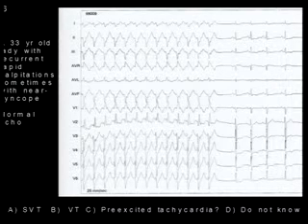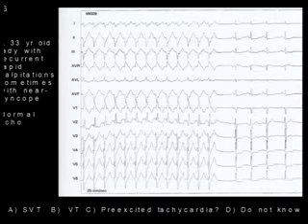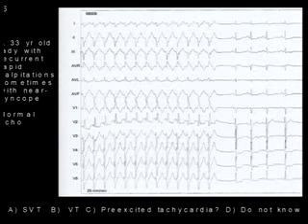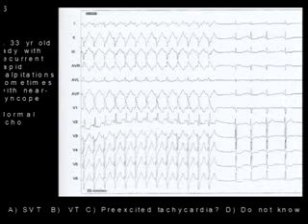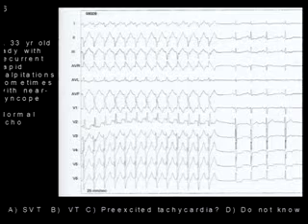So this is one of those that can fool you, but I think you have to commit this ECG to memory and create a template, because probably 90% of the fascicular VTs look exactly like this. Right bundle, left axis, with predominant S waves across the lateral precordium. Occasionally you see ones that originate in the left anterior fascicle, but this is 90 to 95% of them. So memorize this ECG because almost all of them look like this, and you may get it wrong. Next.